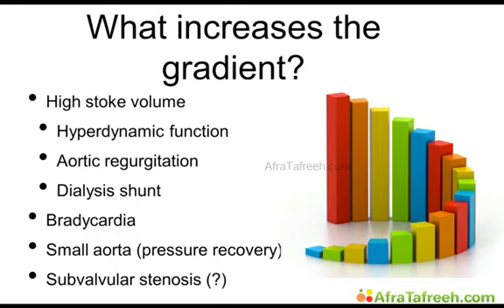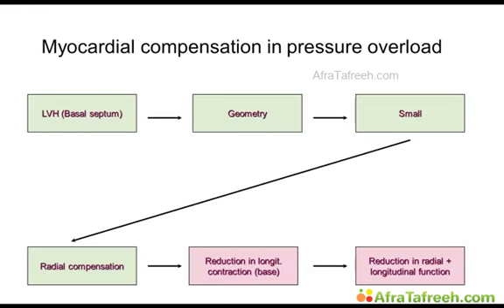And so the pressure right before the aortic valve, between the subvalvular and the valvular stenosis, is low. Therefore, the gradient is high. So if you have something which you see very commonly, namely a subvalvular stenosis and a valvular stenosis, then the valvular stenosis can easily be overestimated in this case. Okay, so, but what happens with the myocardium?